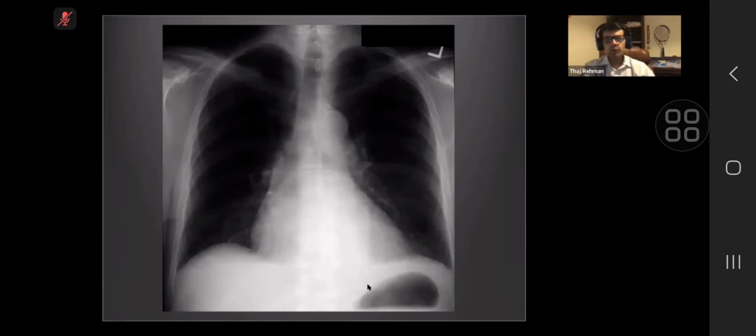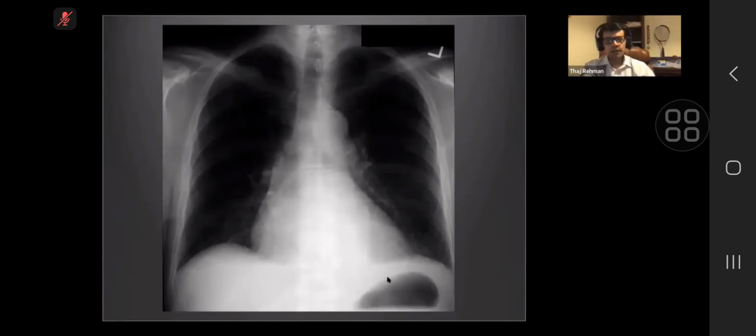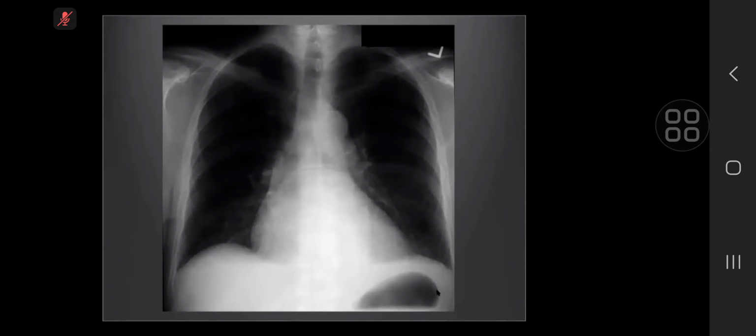If you see that, what would you do next? We could do a lateral. Yes, or you can take it a bit further than that. Is the gastric air bubble smooth? Is the contour smooth or irregular here? Very smooth. Very smooth.